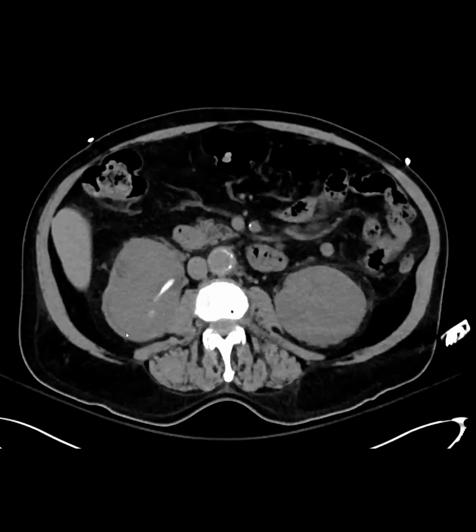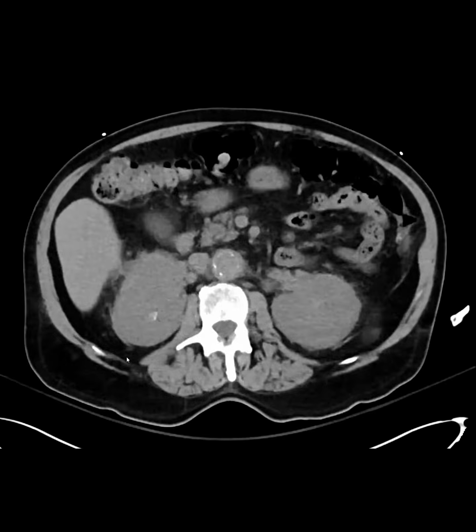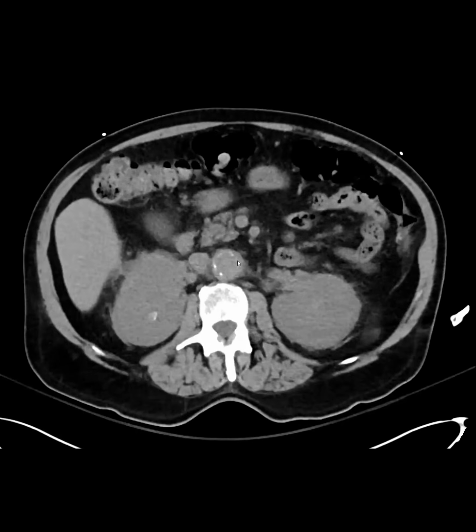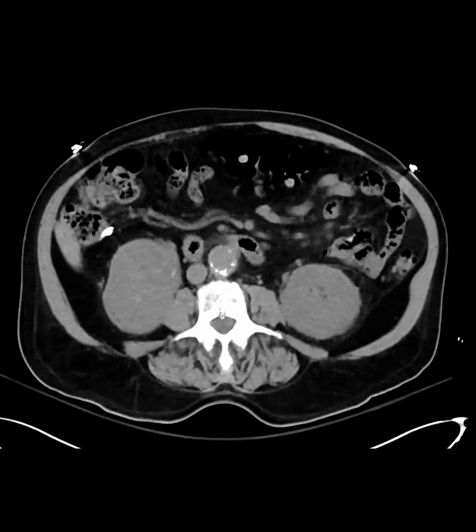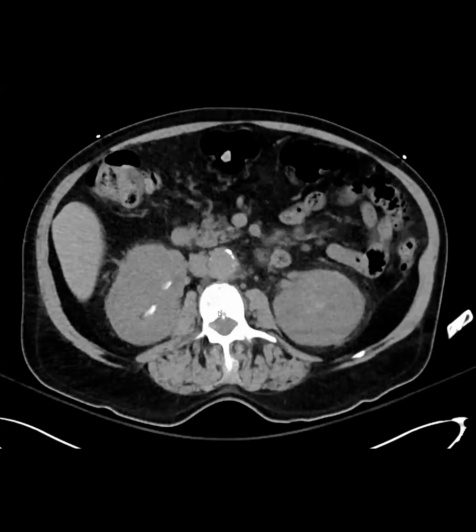I want to point out one thing though. Do you see this little rind? You can almost see a rind, right? Yeah. They're both dead kidneys or something. Okay, they could be dead kidneys. And then the aorta, what do you think about the aorta? There's stranding, some kind of inflammatory process happening around the aorta. Yeah, you can get aortitis and then clot up the renal arteries bilaterally. Okay. Anything else? What else? You can dissect it, I don't know.